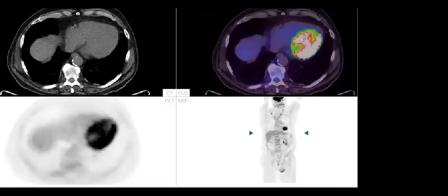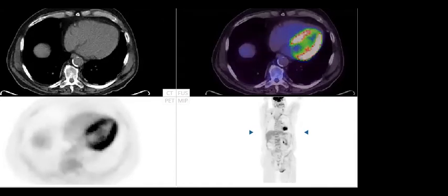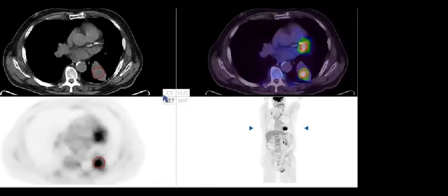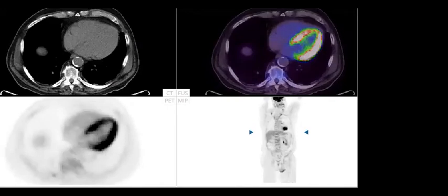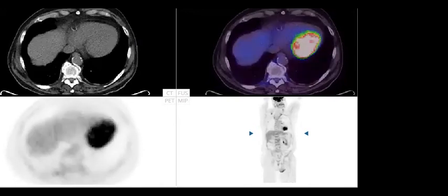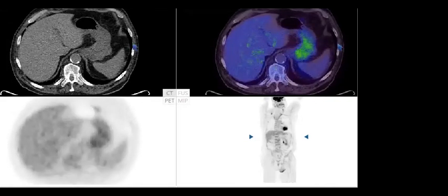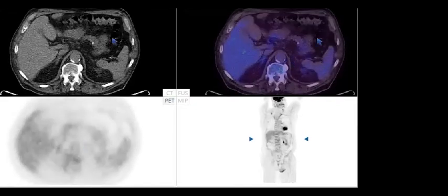Then you check for any nodal metastasis, or M metastasis. So you check for the T, N and M. T is for the mass and the metabolic activity of the lesion, and if there are any other lesions. Then the N is for the nodal metastasis. Then finally for the M staging, if there are any other lesions, for example in the liver, and as here it is lung cancer, you will check the adrenals. It will come now.